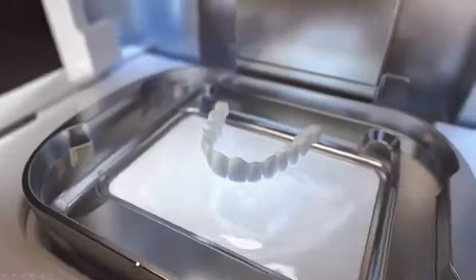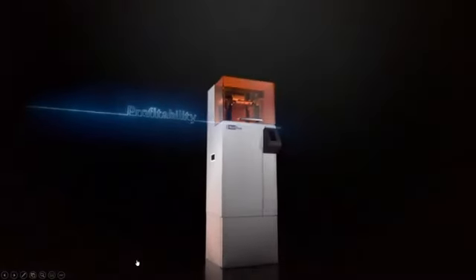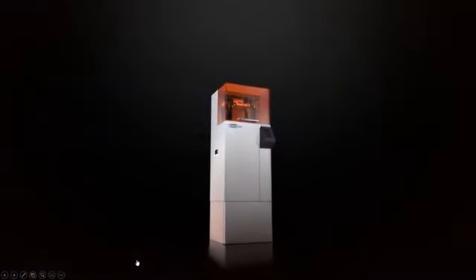We kick the series off today with a session on 3DSprint, our nesting software from 3D Systems. As many of you already know, this software is of course much more powerful than just nesting, and we will address all these functions that 3DSprint offers that will add value in your daily dental workflows.